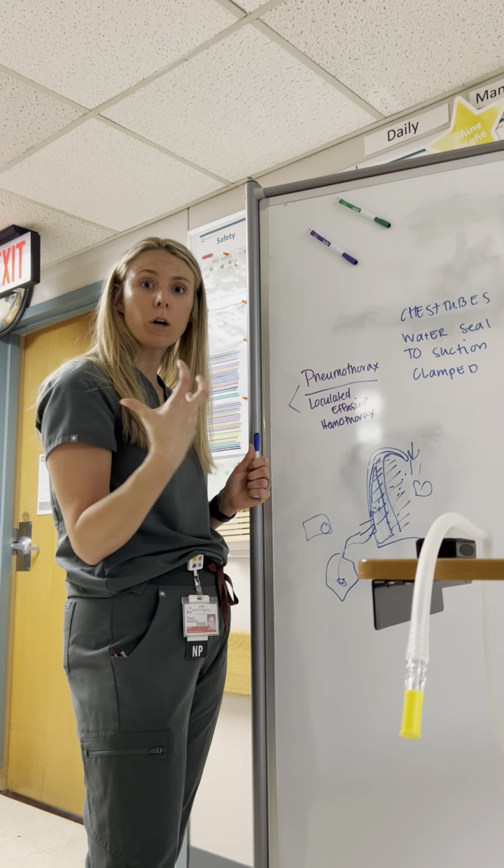This piece here is gonna hook up to the chest tube on the outside of the patient, and then there's suction tubing here. This is where it's gonna hook up at the top of the device. There's a little arm. You put the suction there, and you put the other tip of the suction to the regulator on the wall, okay?